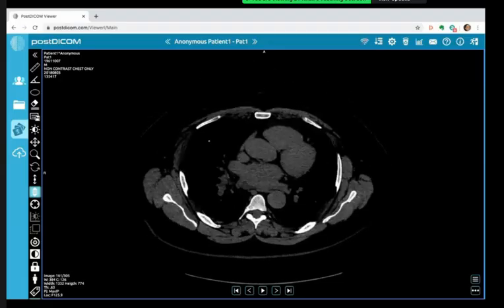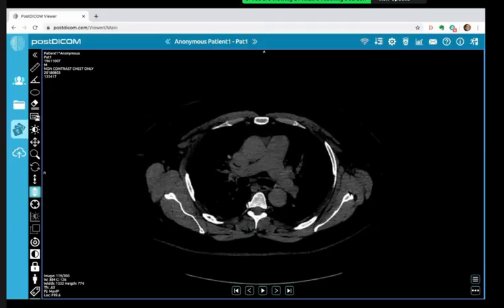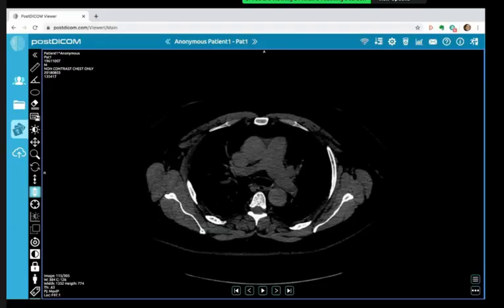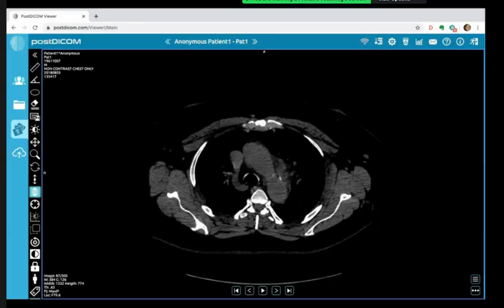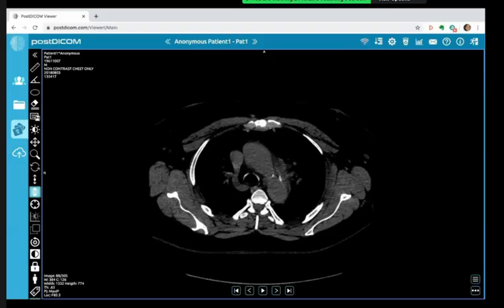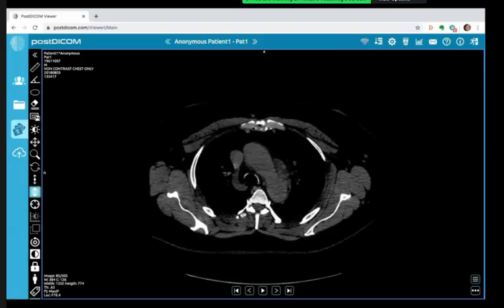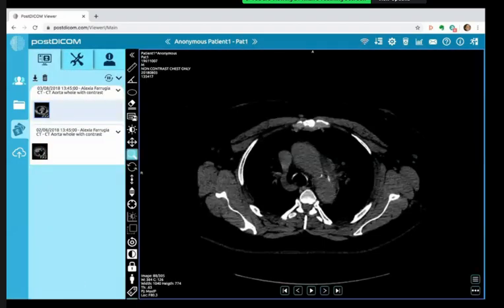Yeah, there was a bit of hyperdensity, and I think there was an atherosclerotic, with mural hyperdensity, basically intramural, and slightly proximally there was a focus of calcification. I think atherosclerotic. I was just wondering whether there was a penetrating ulcer there. The adjacent fat was a bit stranded, so obviously we'll see in the proper windows, but definitely there is an intramural hyperdensity suggestive of... Okay, great.